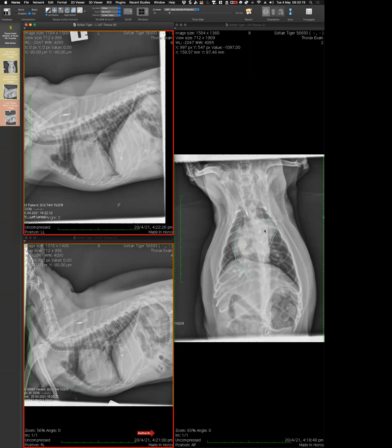Maybe just backflow. Yeah, maybe you do get enlargement of the veins. I would think you would get right-sided heart failure and some loss of serosal detail in the abdomen, which we don't have. You could get some enlargement of the lymph nodes in the perihilar area. I don't actually know what that looks like, but maybe that would explain the increased opacity that we're seeing there, and sort of a little bit of a very regular, not a diffuse increased opacity there. Maybe that would explain that.